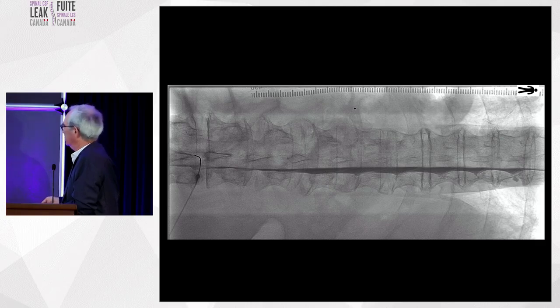And with the dynamic CT myelograms as well, you'll hear from Dr. Callan, probably doing this in a similar way. This is the useful way to keep your contrast material along that lateral gutter of the thecal sac so that it's covering the orifices of the neural foramina and bathing those root sleeves. You want it very concentrated because that'll give you the best chance to see the flickering and the small little fistulas that are coming off of it.